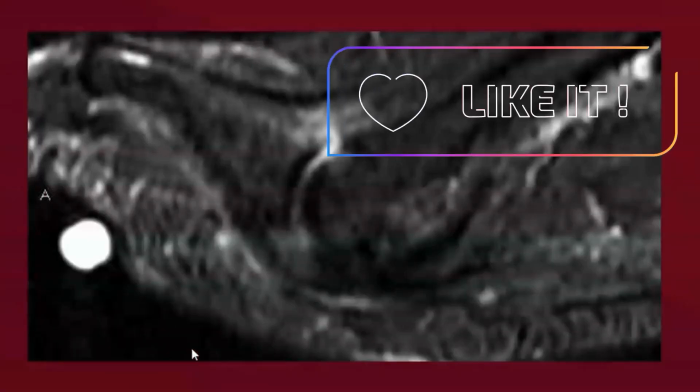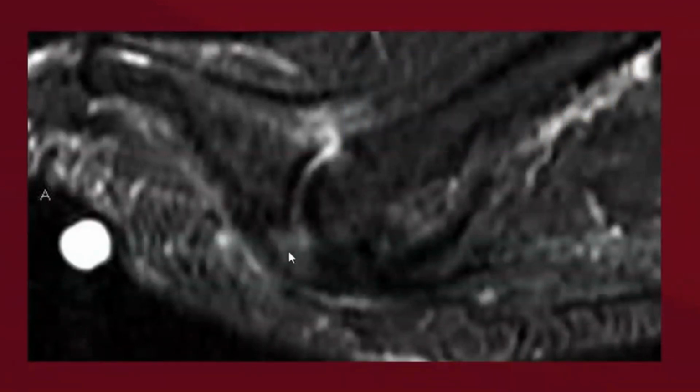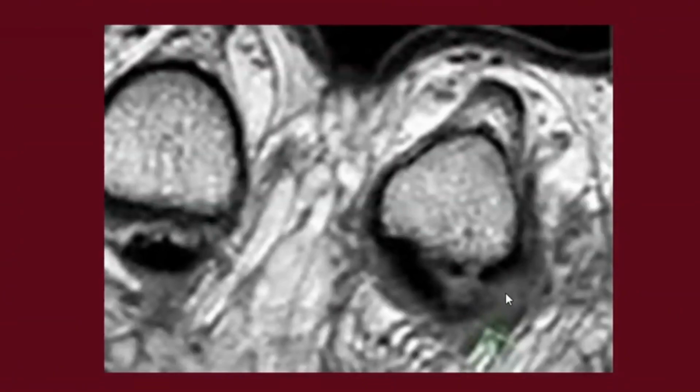We can see here on these examples, the plantar plate has been retracted and pulled away, and we can see a gap that's greater than 2.5 millimeters. Here we can see that transverse greater than 50% of the thickness of the plantar plate and the pericapsular soft tissue change that has infiltrated this T1 weighted image.